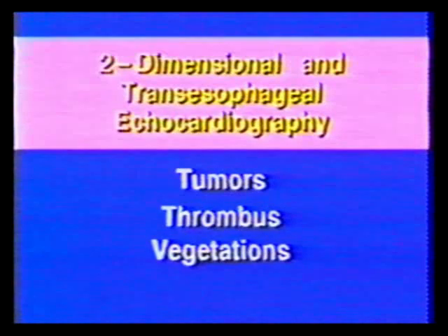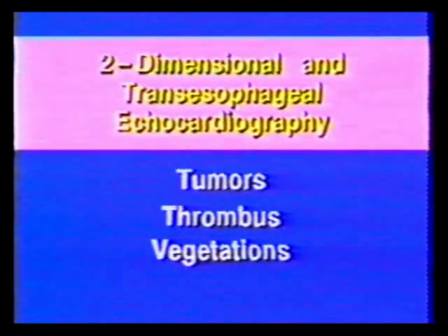Two-dimensional and transesophageal echocardiography have markedly improved the ability to diagnose and characterize cardiac tumors, thrombus, and vegetations. By knowing pitfalls, characteristic presentations, echocardiographic appearance, and pathophysiology, a correct diagnosis can be made by non-invasive echocardiography.